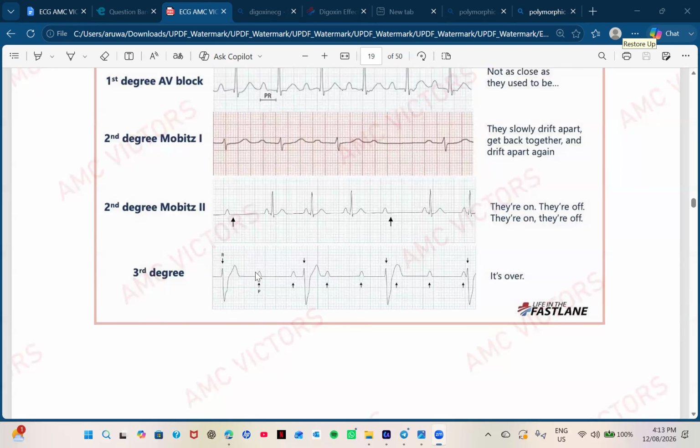So P and P intervals usually have their own regular rhythm, right? Can you see the PP intervals? Usually they have their own rhythm. Right here, can you check the length? Kind of the same, right? Here, again here. Can you see they have their own kind of regular rhythm? And the RR intervals also have kind of the same rhythm, right here.